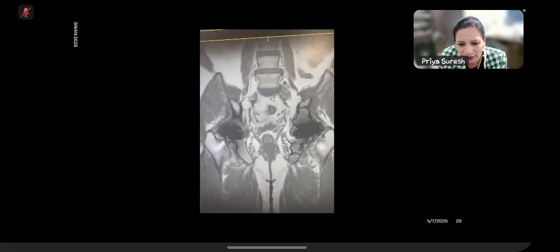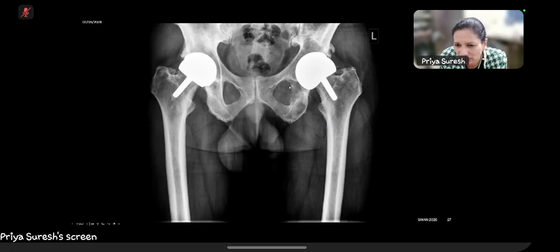Okay, so the plain film was done. If I go back to the plain radiograph, you can see here the lucency. But it's very easy to walk past as well, if you're not looking for it. What I'm saying is the MR was done about, I think, 5 to 10 days after this, so it isn't like there's a big time difference. So this whole thing is abnormal.